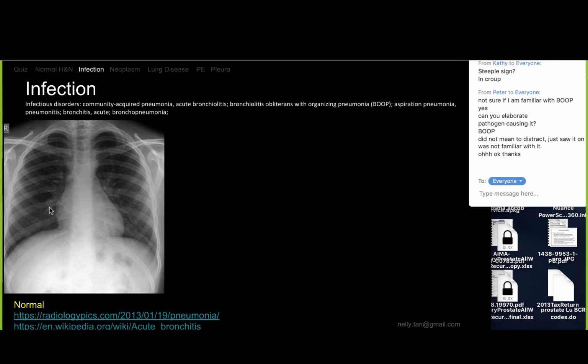Okay. So this is a normal chest radiograph. This is probably a PA, like a posterior anterior, because the heart is small. A PA, as we said before, like if you have the headlights, which is the radiation source, then in the PA, the patient, or I would be facing the garage door. So the heart is closer to the garage door, so it's going to be smaller. In contrast to AP, which is typically done portable, you're facing the car, the headlights, so then the heart will be bigger because it'll project into the garage door.